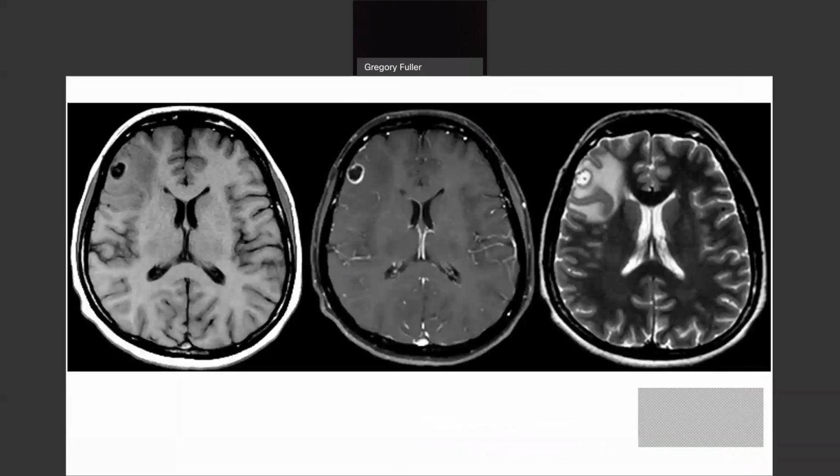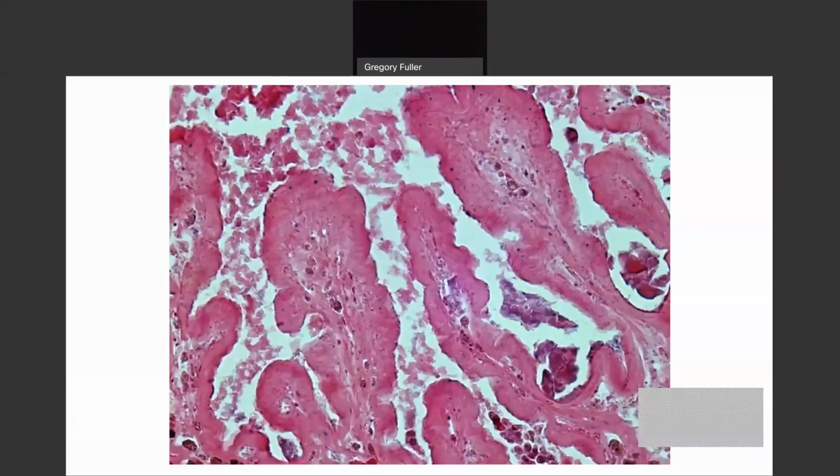It's going to be a solitary lesion, and it's going to be in a patient that has no history of travel to an endemic area, no suspicion that it could be cysticercosis at all. Do you see a scolex, little bump? I don't know, maybe, not convincing. This sort of patient ends up in the cancer hospital or the general hospital with a cancer diagnosis. And they go in, they take it out, and you'll be lucky to get this.